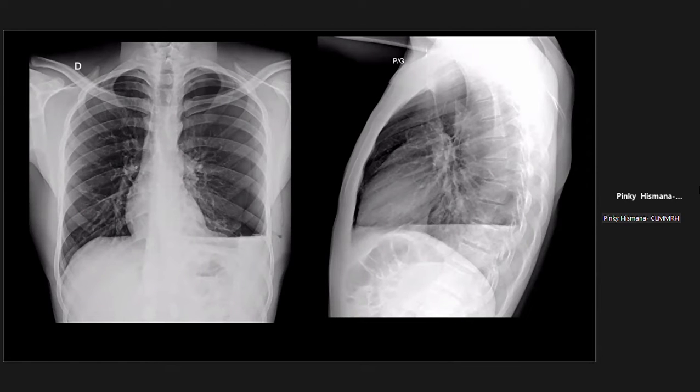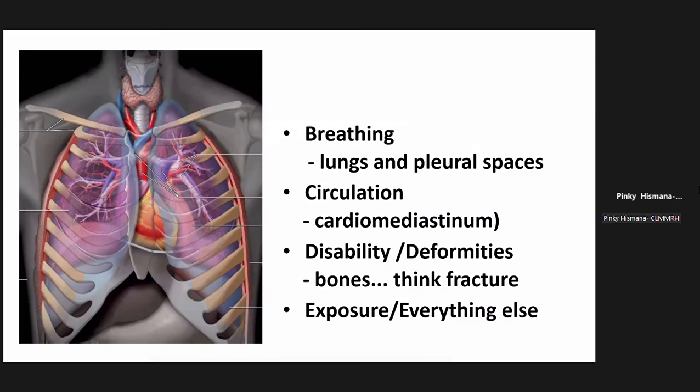Then we have a case here of a mixture of pleural effusion or hydrothorax, the other term we use. If it's blood, then we use hemothorax. Then this one is actually a case wherein you have a mixture of fluid and air. Laterally, if you notice, there's a lucent lesion. There's lucency at the periphery of the left hemithorax. On the other hand, there's a level of opacity at the lower portion of the left hemithorax. So this is actually a case of pneumohydrothorax.